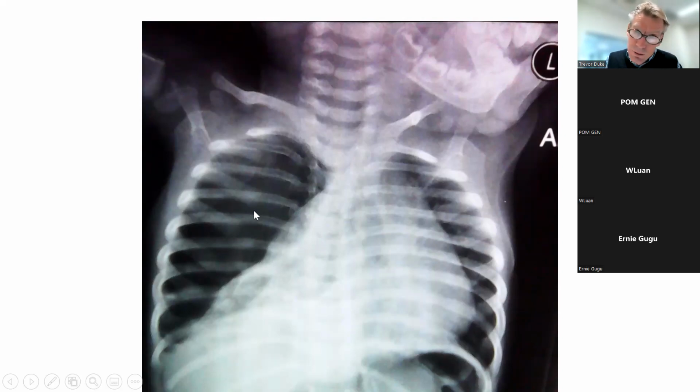And so the right upper lobe is taking all the air, and there may even be an element of gas trapping in the right upper lobe, leading to this over distension of that right lung. I think it's a little complex, but you should just identify that this is a rotated film, so perhaps the clinical signs don't match as well as they might, but this is clearly a large area of right lower lobe collapse.